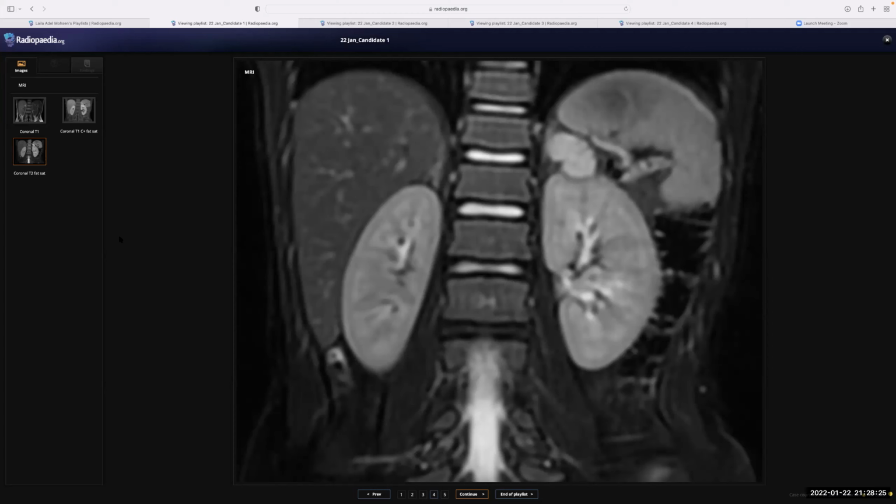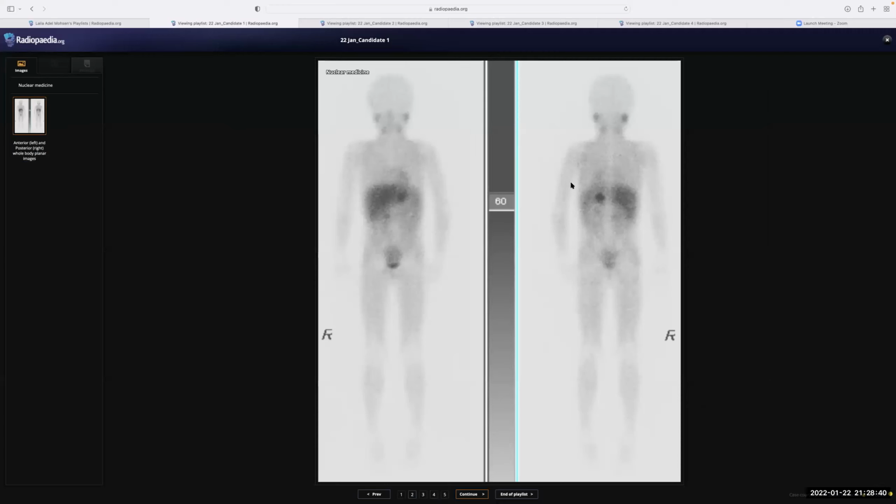Okay, fine. So actually, that's well done, Dr. Asad. This patient had a von Hippel-Lindau tumor. Oh, okay. Yeah, right. Sorry, von Hippel-Lindau syndrome. Right. For the nuclear scan, I'm not a professional with nuclear scans as well, but I tend to follow to see if there are bones, so it is a bone scan. If not, then I will shift to something else.